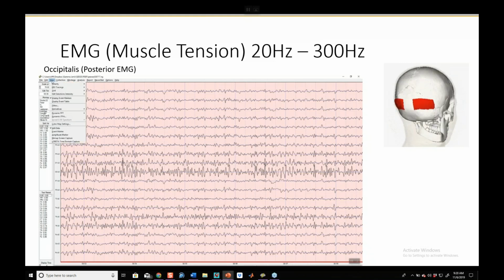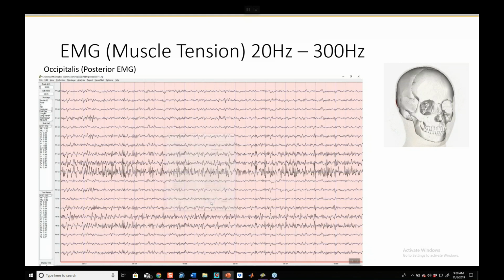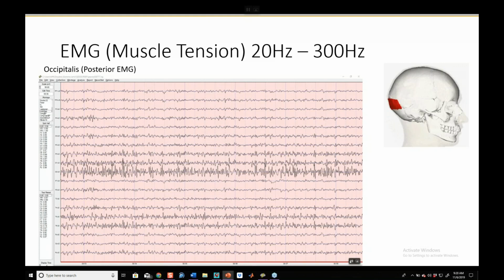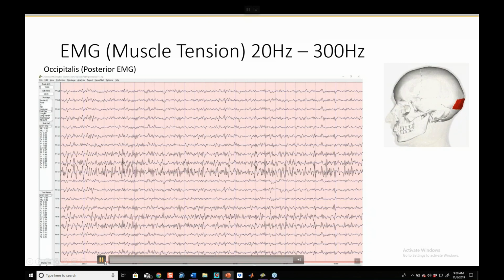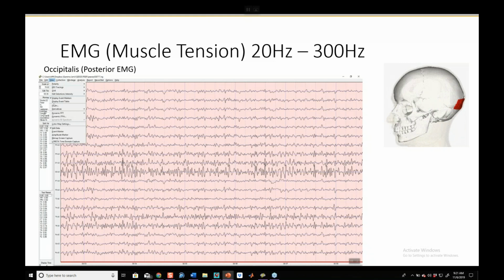So what I'm going to do here is I'm going to take off the low pass filter. Boom. What I've done there is now I'm allowing everything beyond 40 hertz into the EEG, right? And what that does as a first line of defense is it allows me to say, and I'm going to play this one more time as I complete my description, ooh, we have some beta happening at O1, O2. It has rounded tops. That's the morphological signature.